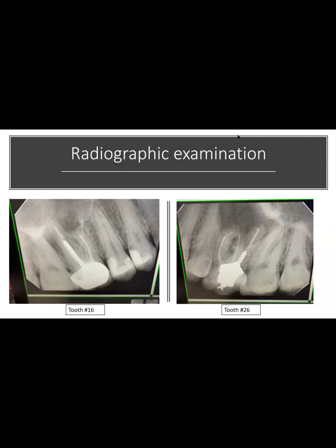The way I see it is it's pretty uniform. Right. Is it cortical? Is it corticated? I can't see that. You know what, the one on the mesiobuccal, yes, it is. The one on the distal, I can't really tell. Okay. What about the 2.6?